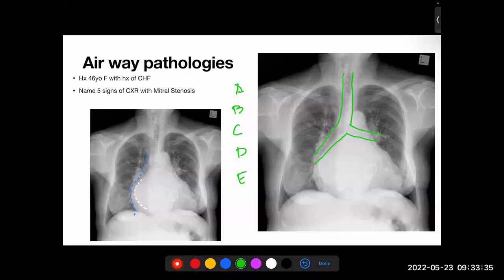I think because of the cardiomegaly, the branching has been affected in such a way that usually the right is the one that is supposed to branch first, then the left. But in this case, the left has been lifted. Okay, that's not exactly the word, but I think you are on the right track. But there's something very simple you guys are not saying.